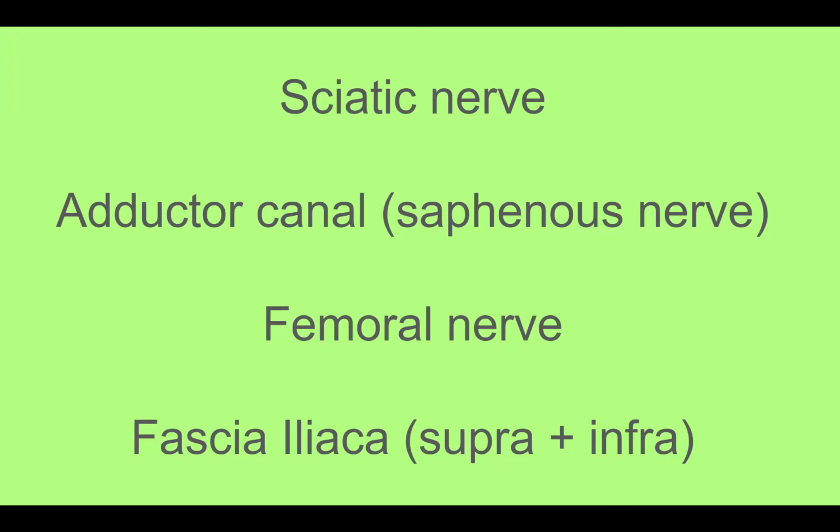So the sciatic nerve block with the popliteal approach. We'll also have a chat about the adductor canal or saphenous nerve block, the femoral nerve block, and then we'll finish with the fascia iliaca block and discuss both the supra and the infra inguinal approaches.